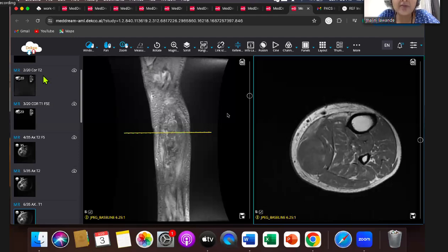How to identify T1 and PD? Fluid is dark on T1. On PD, the fluid is more like T2, more towards T2. And then look at TR and TE, if that is also a doubt. Can a large soft tissue sarcoma and hemangioma be each other's differential? No, usually no. Hemangioma is more lobulated, T2 hyperintense, with interspersed fat areas, which does not happen in a soft tissue sarcoma.